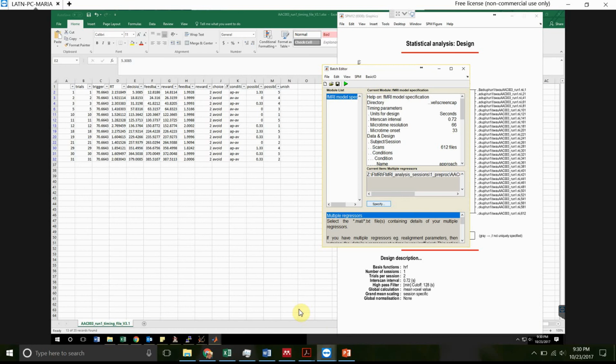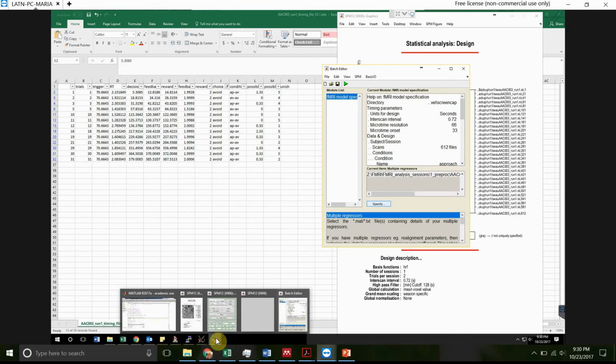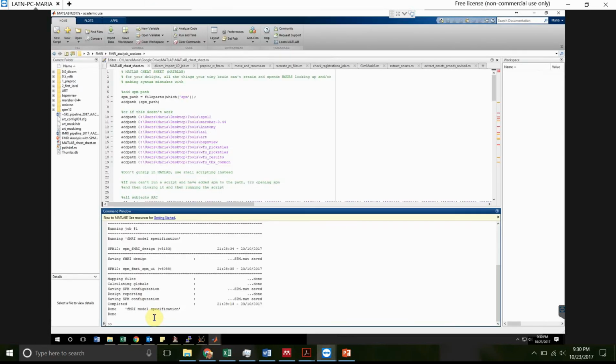analysis. However, if you think about having lots of different subjects and lots of different conditions, you can see how manually copying and pasting your onsets in would result in a lot of human error. So I'm going to show you a more automated way to enter in these contrasts, which will lend itself better to scripting. So the first thing that you need to do is create an SPM multiple conditions file. Now, this will require a little bit of MATLAB coding, which I won't go into now, but I'll just show you the structure of the file.